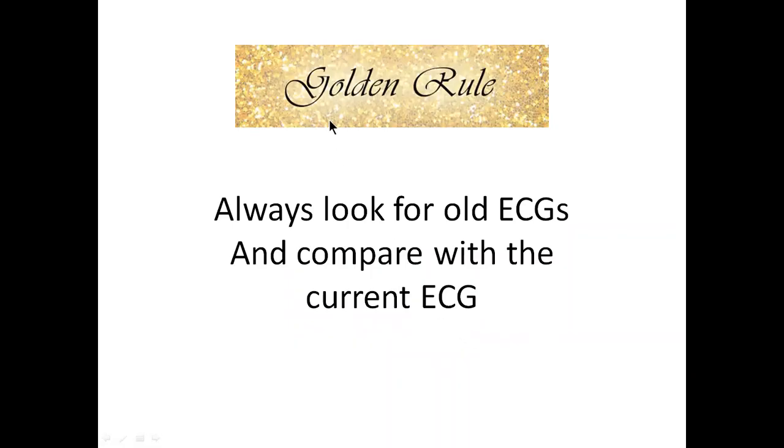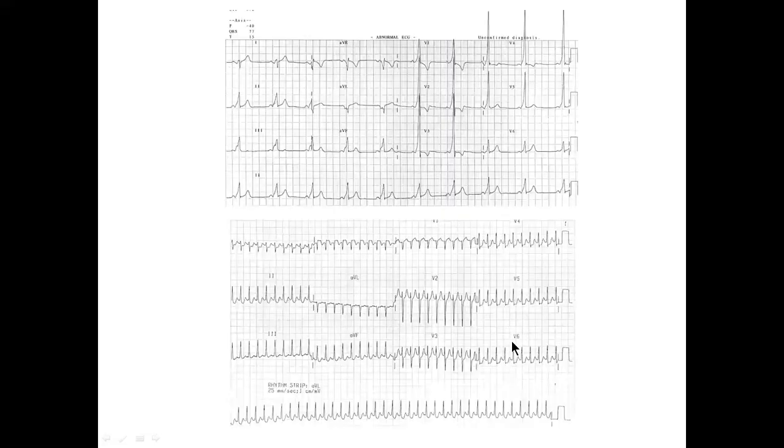Okay, now before I share the next ECG, I want to tell you one golden rule. You should always look for old ECGs, okay, and compare with the current ECG. And let me show you why you need to do that.